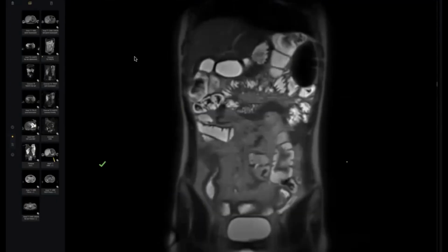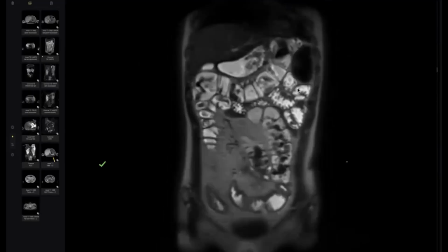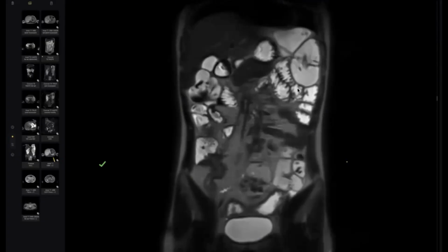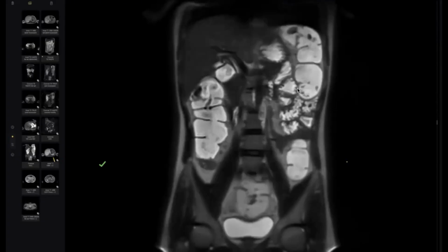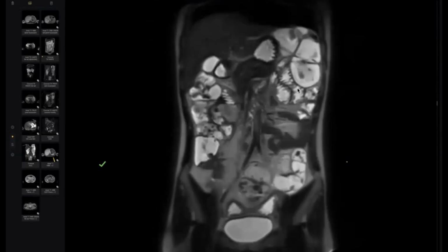Yes, he takes a lot of fluid, maybe mannitol, to distend the bowel. So don't rush and diagnose bowel dilatation before you search and investigate the whole study. By the way, the colon is normal. Don't worry about the colon.